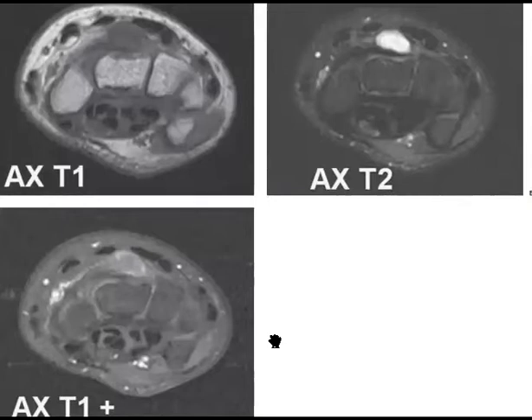You should describe it, especially the location, and whether it has any relation with the tendons and the adjacent bone. In MCQs, the most common soft tissue mass around the wrist is the ganglion cyst. So they consider it like this.